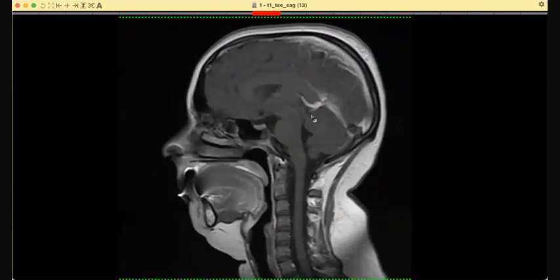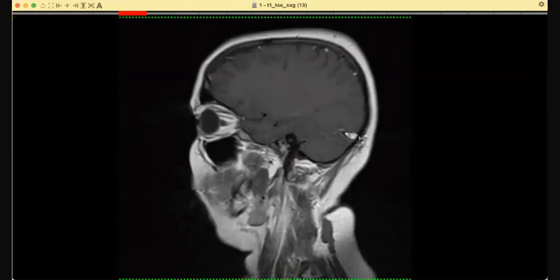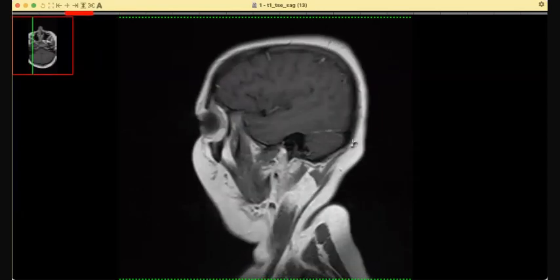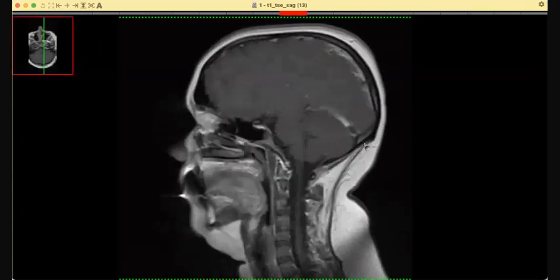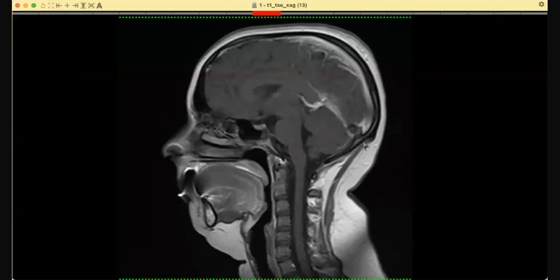Of course, I did not show you a sagittal, but on a sagittal also you can pick up this. This is the normal side, and this is the abnormal side. You can see this filling, just like that delta sign. All of this you can pick up. So you have to remember that dural sinus thrombosis is a very important exam case, but they will show you a presentation which is slightly atypical.